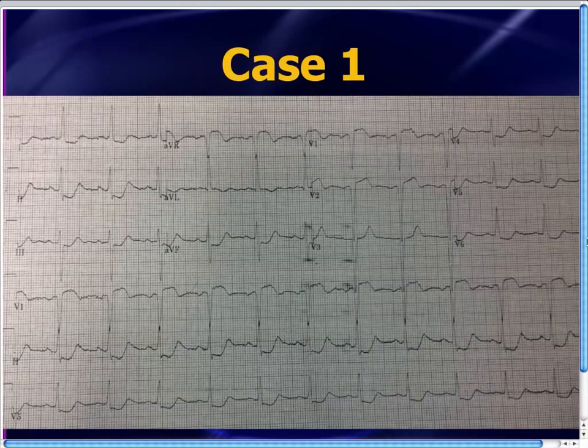My interpretation is simply ugly. As they say, UGLY. This ain't got no alibi. Yeah, even this EKG's mama would say this EKG's ugly, right? So what are you looking for on this 12 lead?